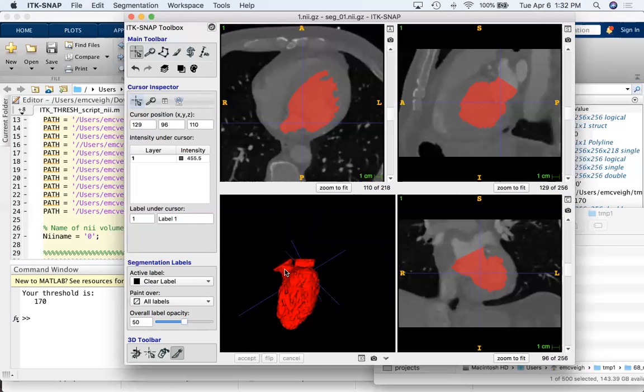Click, cancel, accept. I don't know. When I do it with my left mouse, it rotates the heart. Oh, okay. So click the knife. The knife's active, right? Yes. When you go in, click left once, just click once.